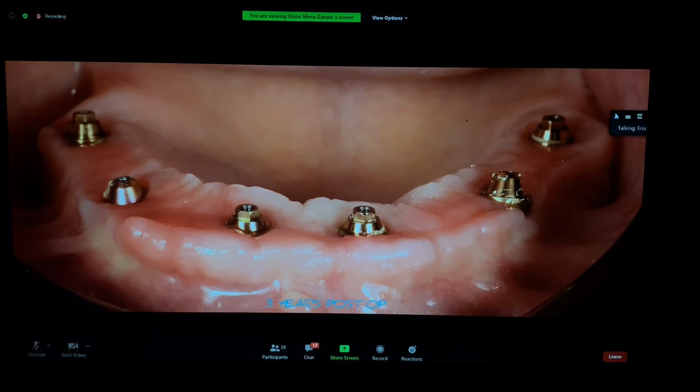The question with the arrows is whether the connection is different from other connections? No, it's the same. I think this is a reflection of the gum or something. It's the same.